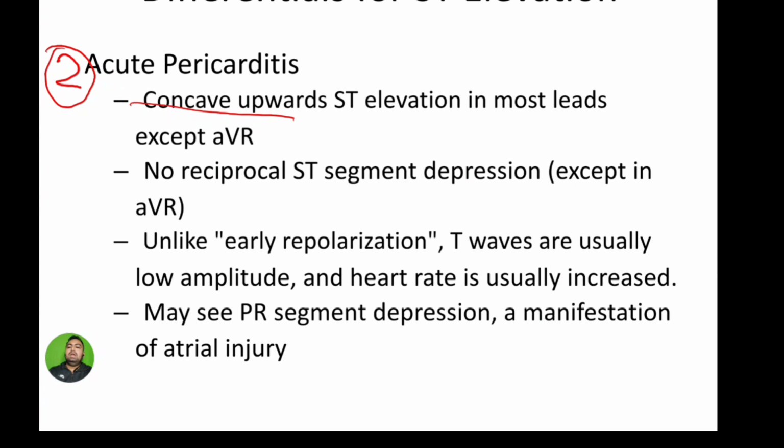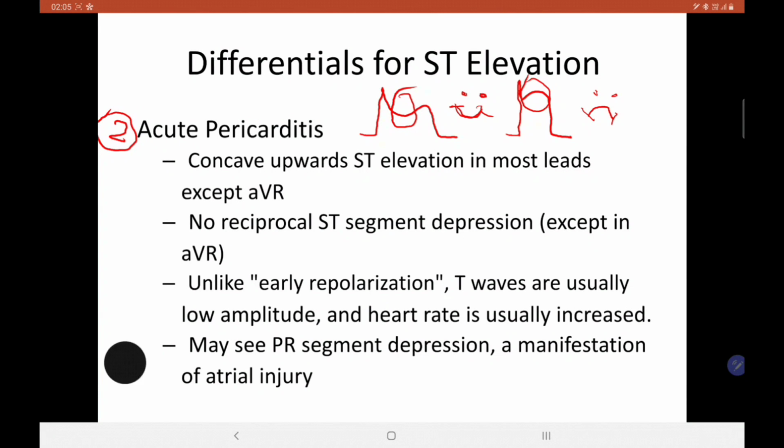It was convexity in the MI, and there is concavity upwards in ST segment elevation in most of the leads except AVR.